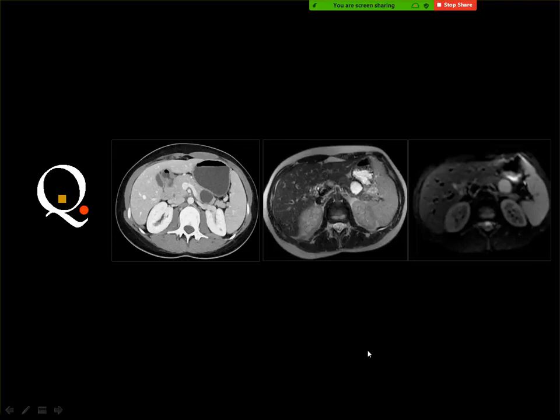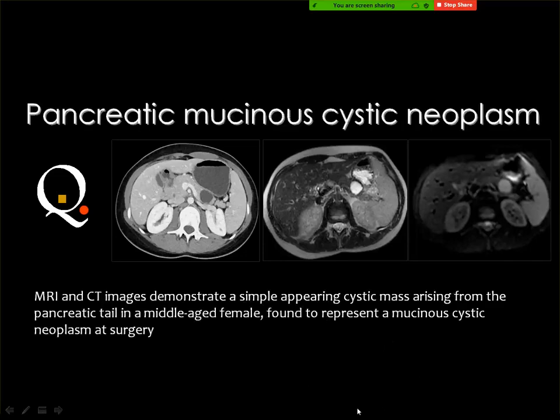Pancreatic cyst. There is no simple pancreatic cyst, and this cyst showed diffusion restriction. Abscess, mucins, tumor. You should know that the pancreas does not have a simple cyst. Whenever you see cystic lesions in the pancreas, we diagnose pseudopancreatic cyst or pancreatitis, pancreatic abscess, or cystic tumors.